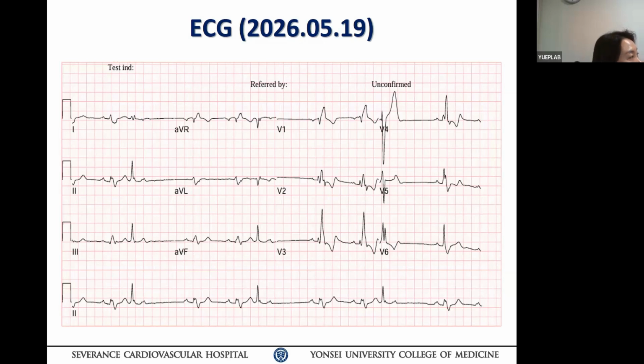There may be some atrial enlargement. Also in V1, the terminal negative deflection, the Morris index is high, so the evidence of atrial enlargement is there. And there are narrower beats which look like PVCs, and because of concealed conduction, the next P wave may be blocked in the AV node. I agree with this analysis. So concealment, right?